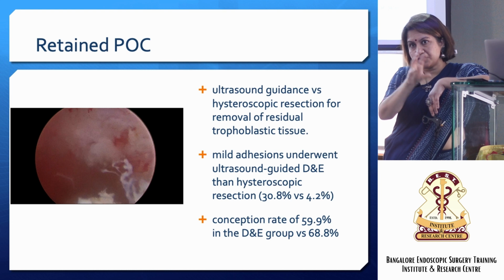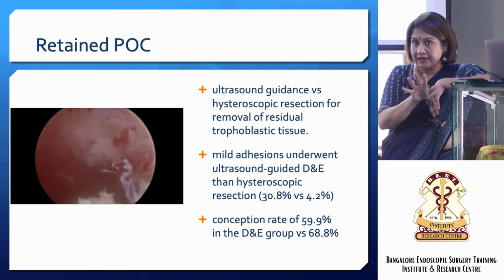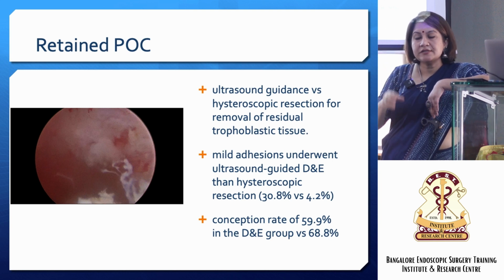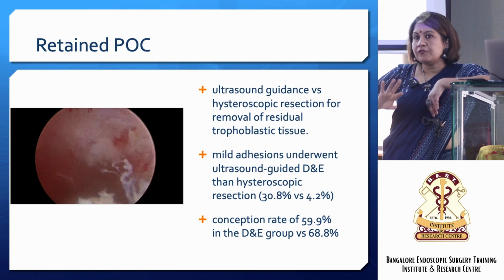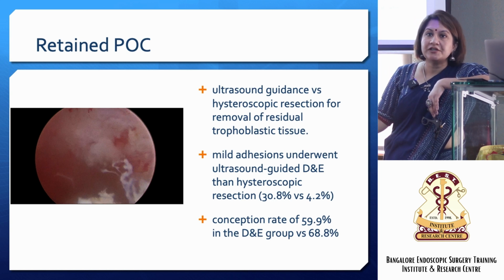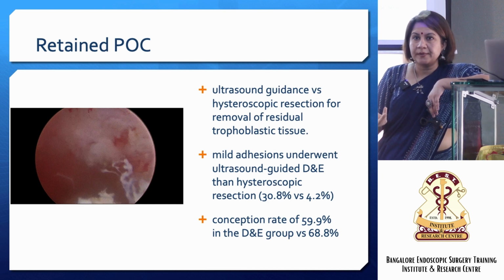There's a proper differentiation of the endometrium and the myometrium. Otherwise, you can see the invasion. In an AV malformation, you can actually see the invasion and echogenicity in the myometrium. Unlike a retained product, where the echogenicity is only in the cavity, it won't be in the myometrium. AV malformation is seen in the myometrium itself. Of course, you need to be a really good sonologist to tell whether it's AV or GTT, but beta HCG is there on our part, we can always pick it up.